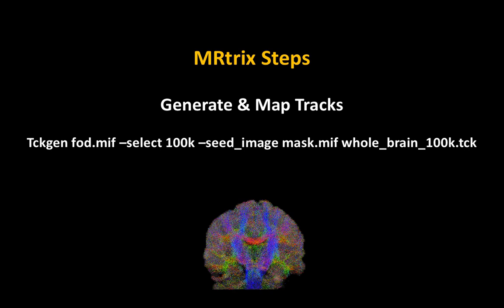So just like we did before, if it's a single voxel that we normalize to a common space across however many subjects we have, we could test whether something like FA is significantly different from zero or different between groups. So similar thing that you can do here with the orientation. But something else which people are probably more excited about is creating this thing called a connectome.